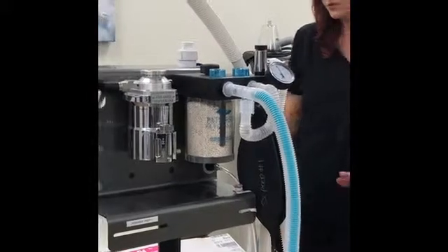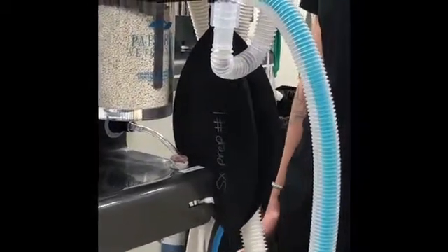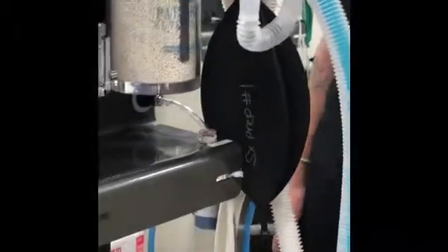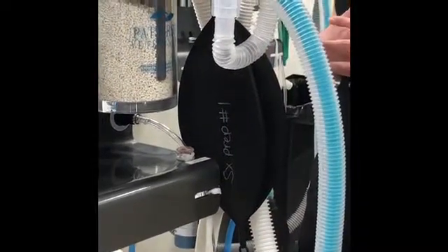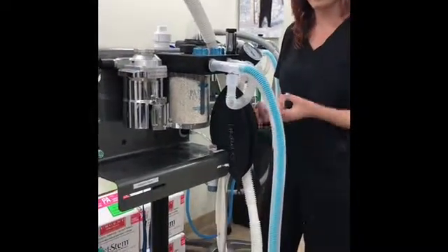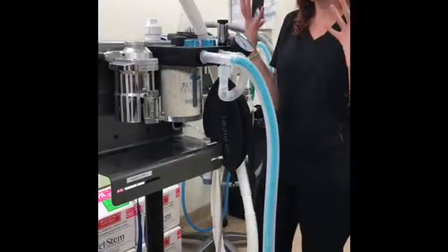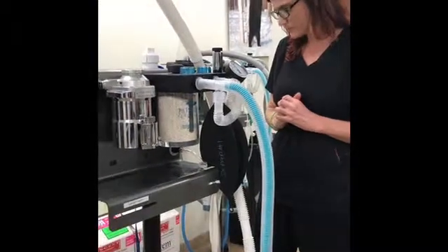So lastly, I did want to talk about our bag again. Its main use is to catch or trap any excess air throughout the system. And a lot of times when it comes into play, not only with helping your patient take a breath, but at the end of a procedure, usually when the procedure is being closed up, the ISO will be turned down to 0, and then we will squeeze with the remaining air left in this bag back into the patient, so that when we remove that bag, that excess waste gas doesn't go into the environment. I think I got everything.